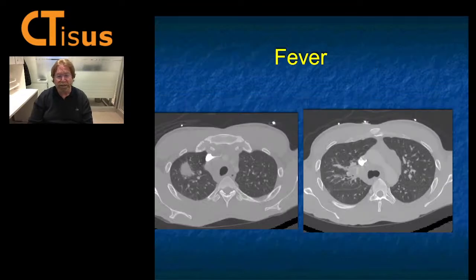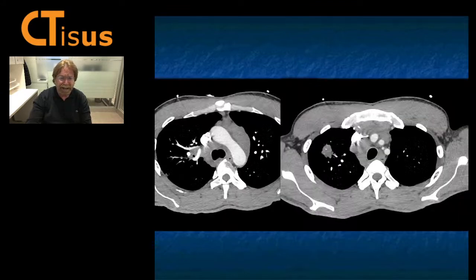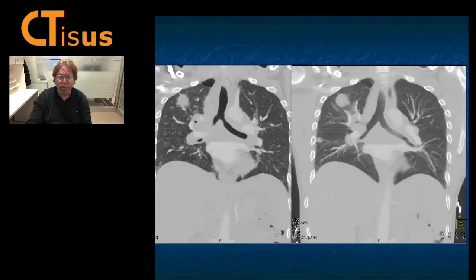Here's a patient with a mass in the right upper lung. There's some infiltration to the right upper lung. There's some stranding by the mass. Maybe it's a lung cancer with lymphatic spread. That's a possibility and a reasonable thought. There's a little bit of nodularity in the right lower lung. There's adenopathy present, which is fairly substantial. Maybe we're dealing with lymphoma with tumor involvement. Maybe a lung cancer. Here it is in the coronal view, the mass, the adenopathy, second mass in the right lower lobe.